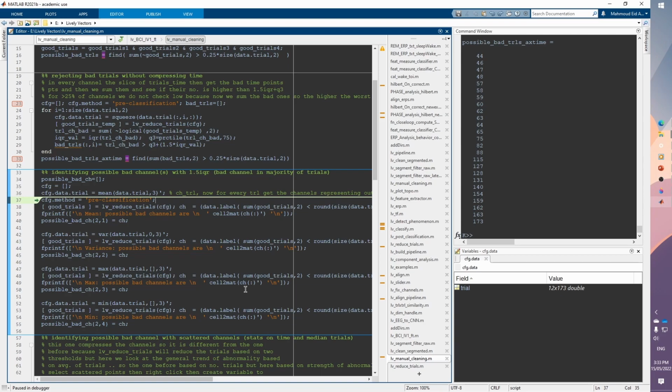What I mean by that is, if this channel compared to a neighboring channel is really an outlier, because it could have a very high scale compared to other channels all the time, you couldn't figure that out just because of this bias. If it's really an outlier all the time, then the mean or the median of this channel will also be very high, and then you wouldn't be able to catch such an outlier.